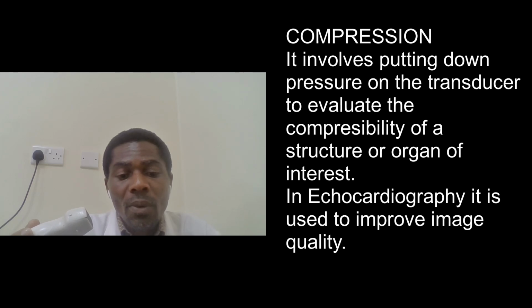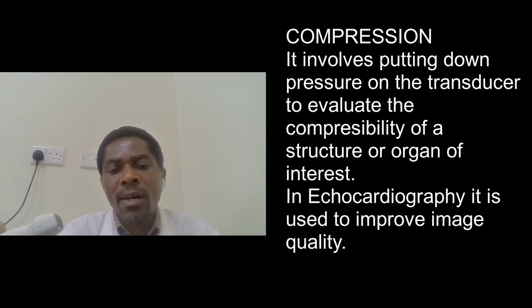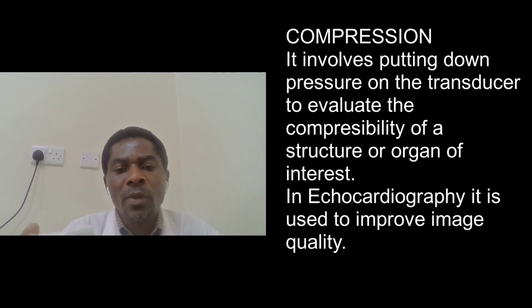In echo, compression is used to improve image quality. So sometimes when you are doing echo, the image sometimes maybe it becomes very difficult to visualize the heart. So apart from other things that you can do to improve the quality of the image, you can do compression.